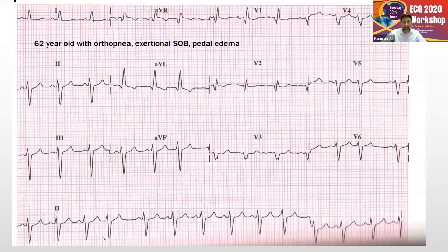And this irregularity that you're seeing in lead 2 is an APC, which comes a little bit after some time. So normal rhythm, and then there is a premature complex. That's why you're seeing a P wave, which is buried here in the T wave. This is a little more pointy. And then there is a little pause for the reset of the sinus. And then you have another sinus, and then another APC, in which the P wave, prematurely, is buried in the T wave.